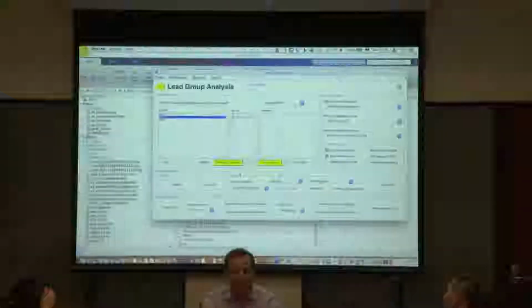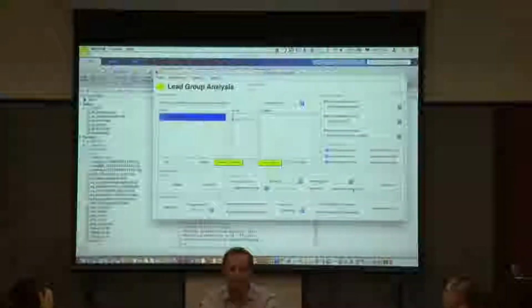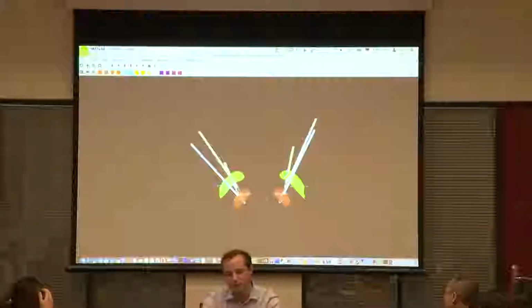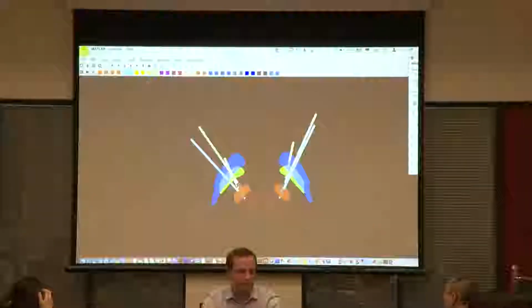So now one thing that we can add is to highlight the active contacts. Right? So we want to visualize the electrodes, but we want to see which ones were the active contacts. And now we see that these are highlighted in red. Right? So that's already helpful for some, I don't know, visualization purposes. That's one other thing.